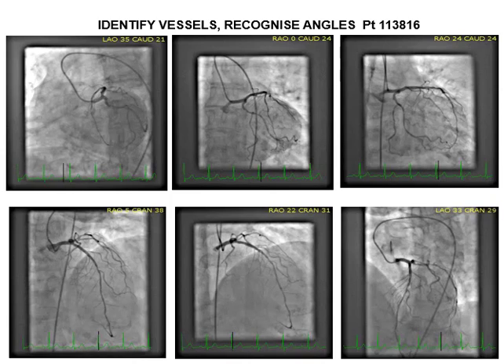Now, I hope that looking at these helps you understand how angulations work in the cardiac catheter lab for both cardiac structures and for coronary angiography. When you do your cath lab term, you will be more appreciative of how we identify these structures and these vessels. Remember to read that paper by Morton Kern and the other references I give you. They're all very useful. And with that, I'll end this lecture.